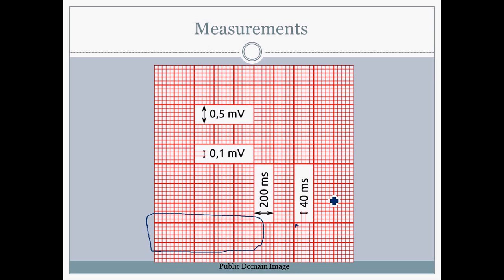Or they might just have enlarged hearts, cardiomegaly, giving you higher spikes. Again, it was not entirely a stress point for my line of work, but it may come up in the future, so you might want to pay attention to what the boxes mean on the vertical axis as well.